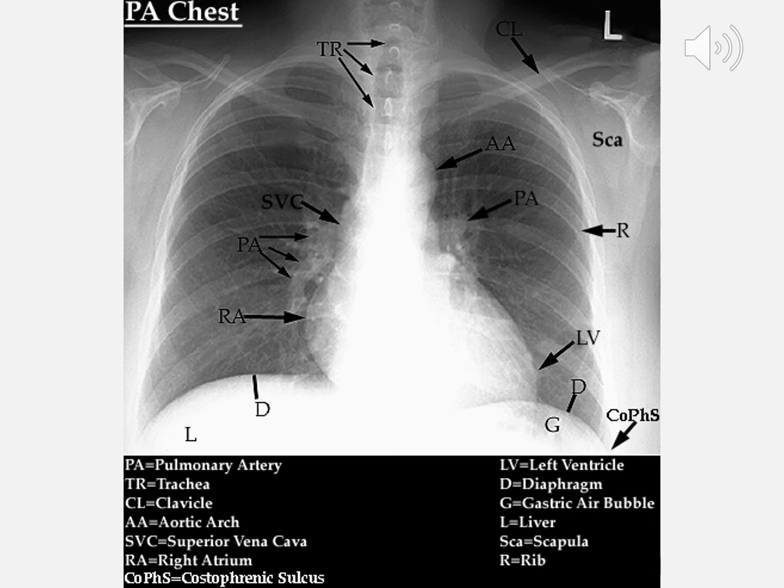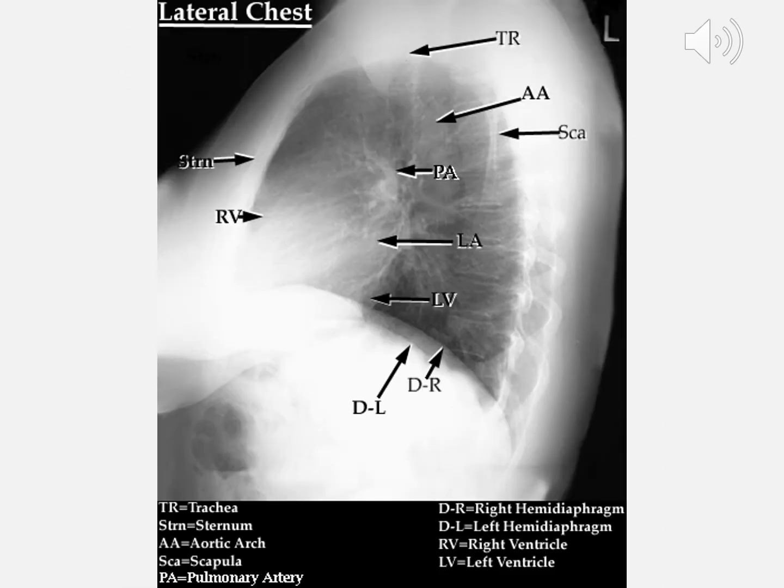So more anatomy just to get to know. This is more anatomy on a lateral view. Again, I'll remind you every slide, these are here so that we can get used to looking at x-rays, identifying landmarks and anatomical structures, and what it is we are looking for in a normal x-ray. So just study these. It'll help to find pathology, maybe find placement, to find abnormal things and understand what they are and be able to articulate that. We may have to look at 1,000 normal x-rays before we begin to find one abnormal and identify it. But this is just for your review here.